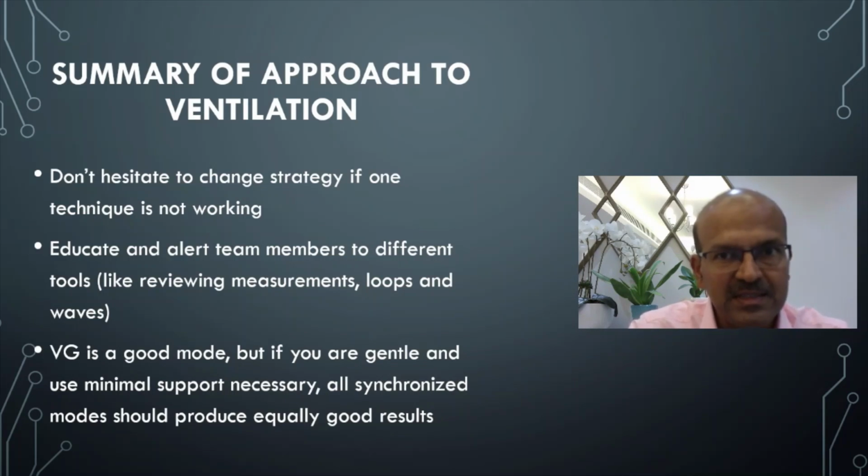If the pressure is reaching consistently 25 to achieve a tidal volume of 6 and the baby needs that, but actually the baby may manage, the oxygen requirement is not that high, and you can try a period of SIMV on a setting of 22 PIP, for example, which is more reasonable, more gentle on the lung if the baby is around a kilo or so, than reaching a PIP of 25 consistently just because you want volume guarantee.